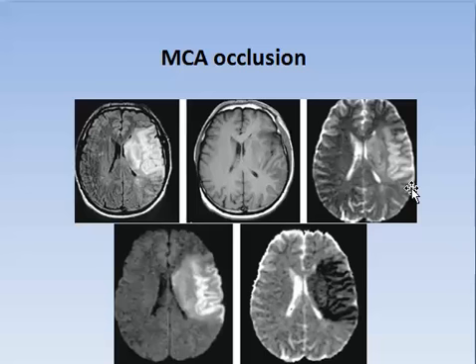In T2 it's not so different from that one, but the difference between the diffusion and ADC map is not so evident, except for some minimal edema medially here, which disappeared here. That's why the core is very big. The core is very big.